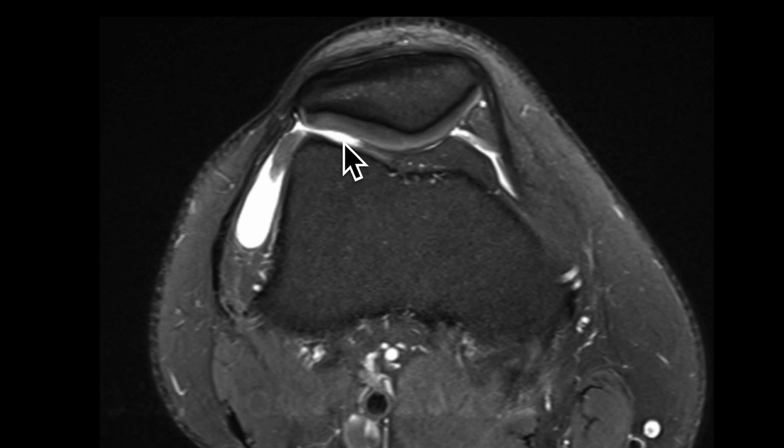Cartilage lesions will present as either a defect, maybe a fissure here, or abnormally increased fluid bright signal within the cartilage itself. The defects can be graded as mild, moderate to full thickness. And for now, the thing to be aware of is that the hallmark of a full thickness cartilage defect will be bone marrow edema-like signal alteration.